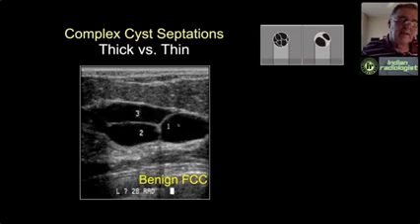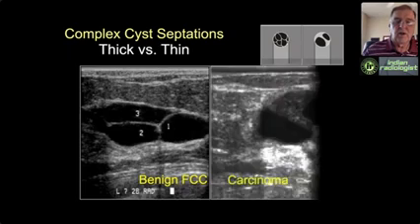And what do I see on this image? 3 cystically dilated acini within that TDLU. And what are the thin hyperechoic septations? They are simply the unruptured walls of acini. So in this particular tomographic slice, I'm seeing 3 cystically dilated acini with the septations representing unruptured acinar walls.